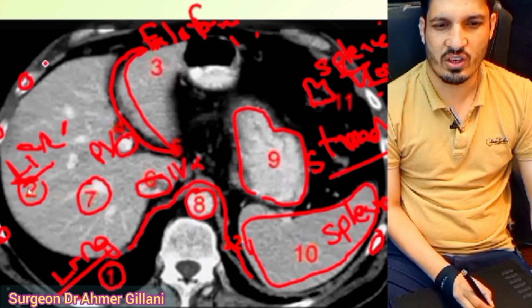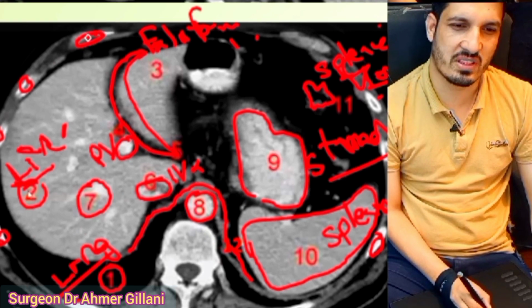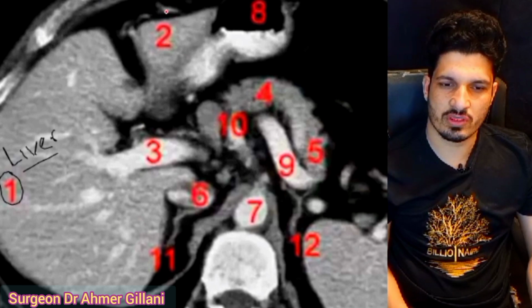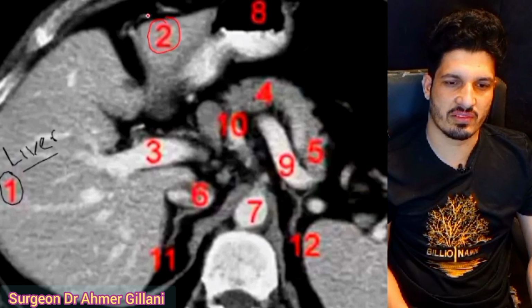Hope you have understood some of the basic structures. You have identified the basic structures. Structure number 2, this is the segment 3 of the liver.